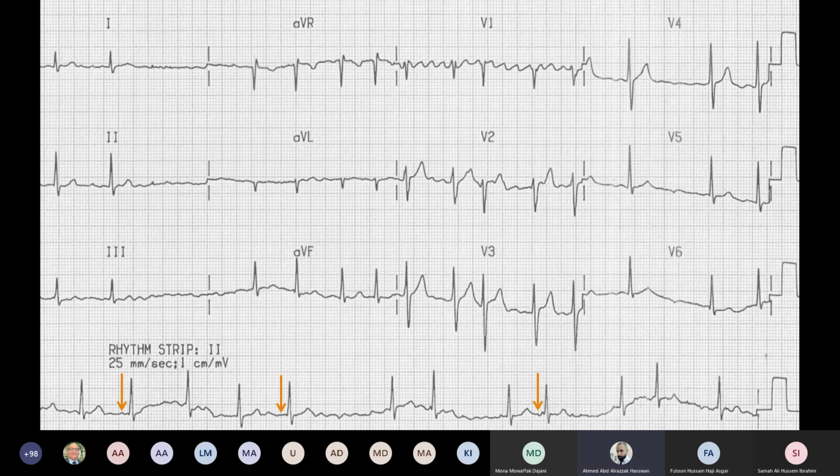And Rita, do we start by looking at lead 2? Yes, usually lead 2 is considered, we call it the rhythm strip. That's why they spread it at the bottom of the ECG. So below, look for the rhythm strip. Usually they spread lead 2 over the whole paper of the ECG. And we'll see why, because lead 2 actually matches the heart axis. That's why it's the most evident one.